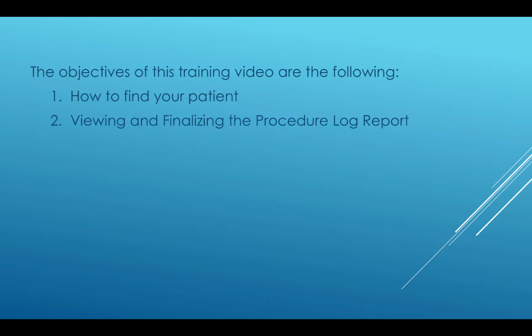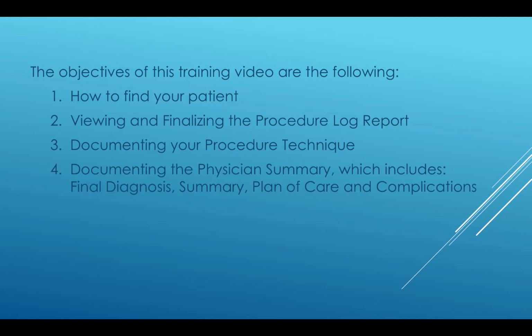The objectives of this training video are the following. 1. How to find your patient. 2. Viewing and finalizing the procedure log report. 3. Documenting your procedure technique. 4. Documenting the physician summary, which includes final diagnosis, summary, plan of care, and complications. And then finally, viewing and finalizing the structured report.